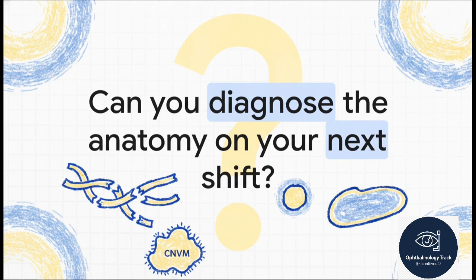So let me leave you with this final thought. On your very next clinical shift, when a bright spot on an FFA progressively enlarges and has fuzzy margins, will you know exactly what is happening anatomically? Armed with this baseline-to-deviation framework, you should instantly recognize that as leakage from incompetent vessels, maybe a CNVM, rather than, say, a fixed-size window defect or a confined pool of fluid.